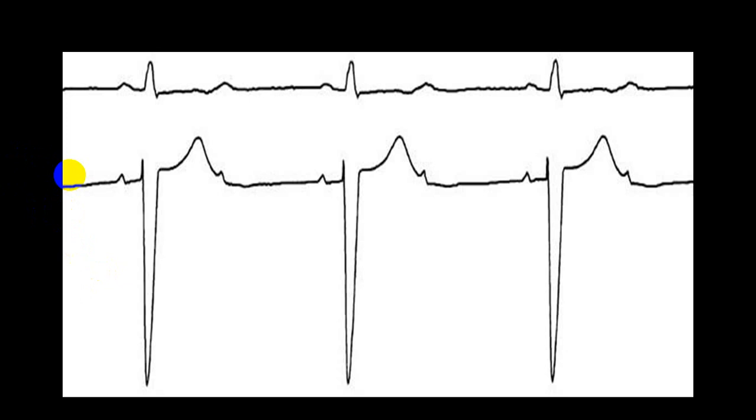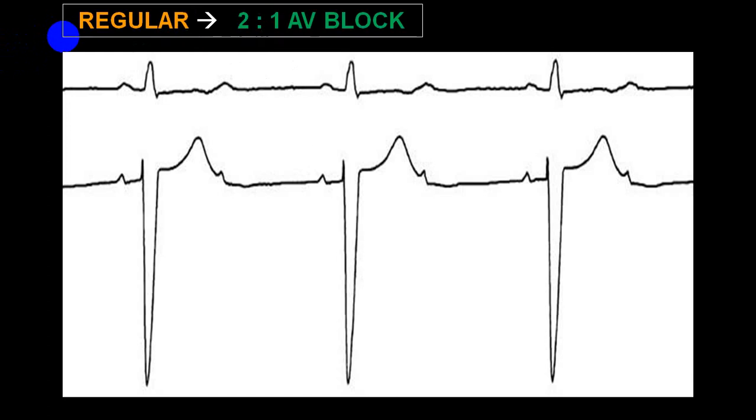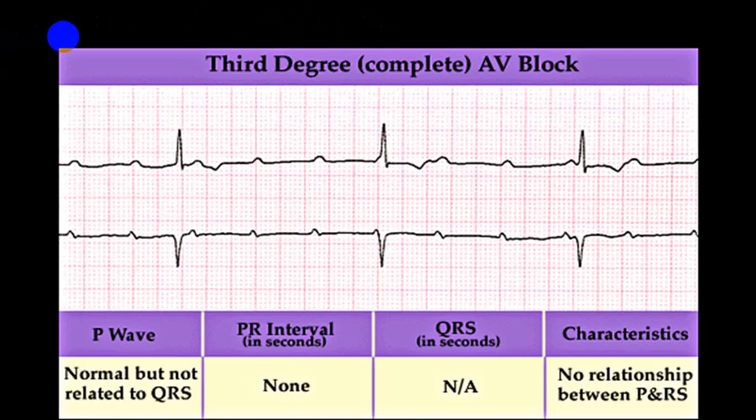But by and large, if you look at this ECG, this will go more in favor of a complete heart block because P wave rate is faster than ventricular rate, QRS complex is broad, PP interval is less than RR interval, hence this will be more in favor of a complete heart block rather than 2:1 block with aberrant conduction.